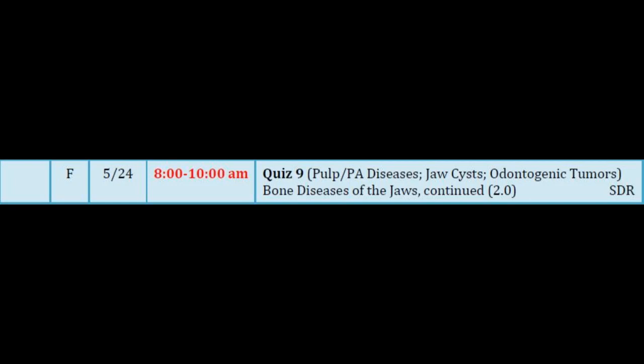So that's strongly suggestive of a lesion of bony origin. So you should give me a benign neoplasm of bony origin because it's beautifully round and corticated. So it's got to be a benign bone forming tumor. We don't know much. Is this bigger than 2 centimeters? Then it could be osteoblastoma. What else could it be? Ossifying fibroma. Could be either one. I'd be really happy if you thought of either one of those. So that's how we think about it.